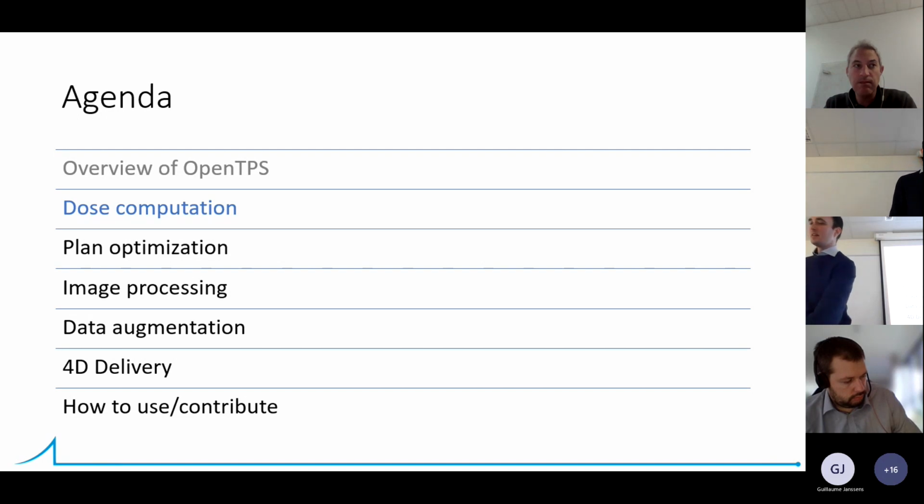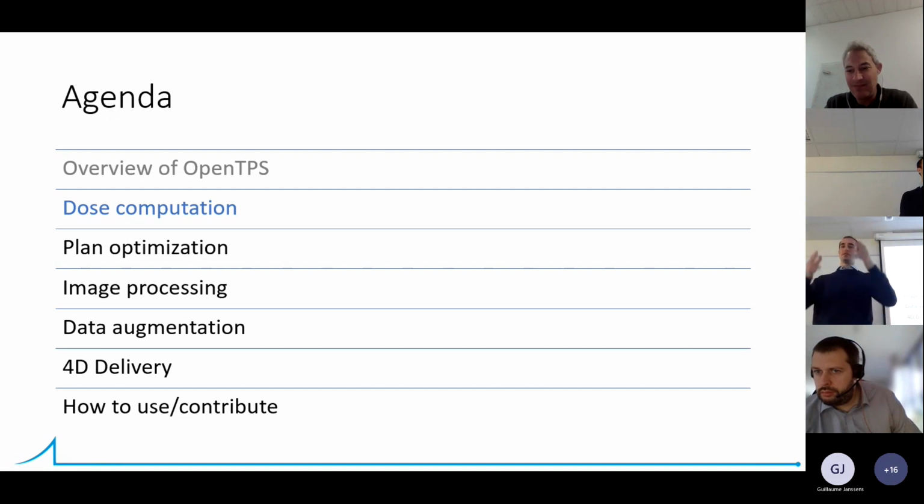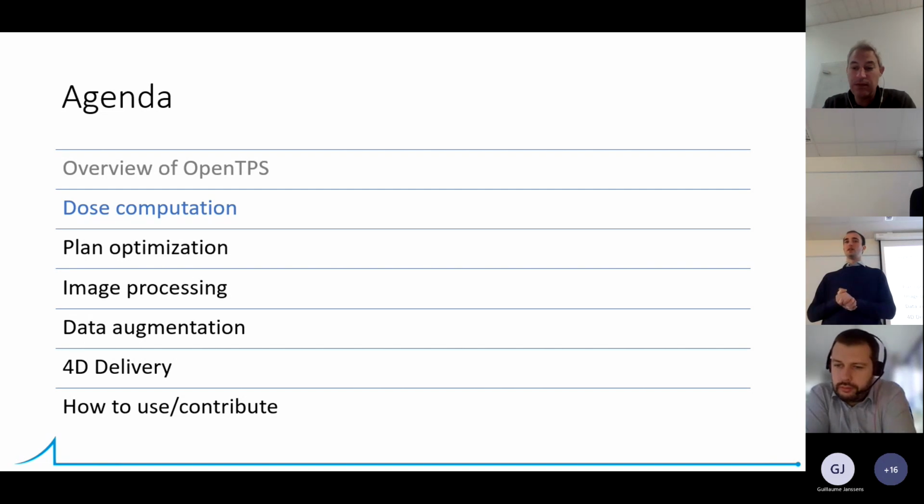So there are many ways to do it. Usually in our lab, all people write their script with their methods using the core library, and at the end, they launch the GUI. But if you realize in the GUI that you would like to do some additional stuff, we provide a scripting window in the GUI, which is very preliminary, from which you can use everything which is available in Python.